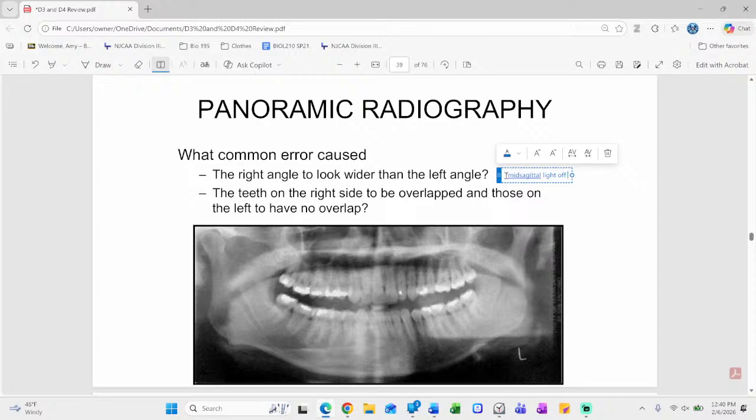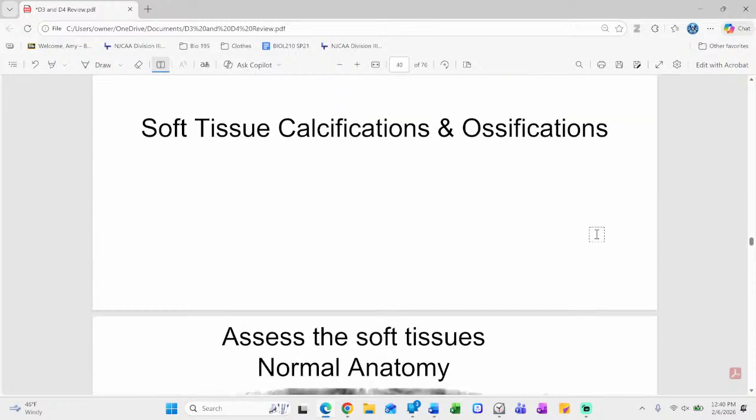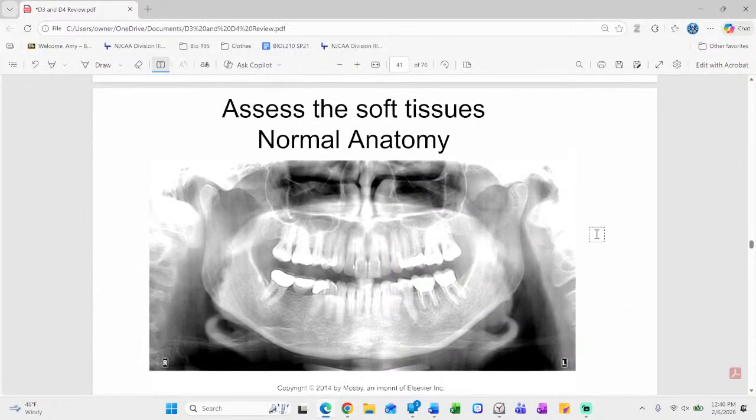Got some good ones. So soft tissue. All right, normal. And you've been with me, everybody's been with me assessing the normal here. We're going to look at normal styloid, epiglottis, right? Looks like my cashew, looks like a comma. And his best friend, the hyoid, which is strung across here, but they are best friends, and you find one, you should be able to find the other.